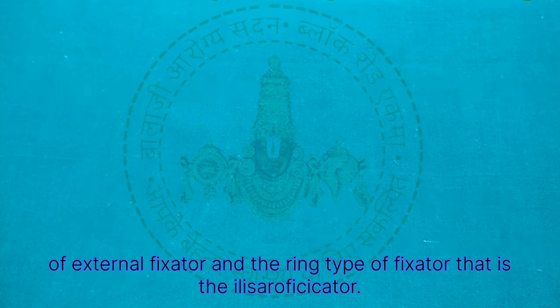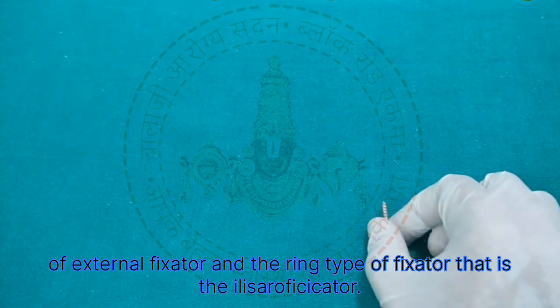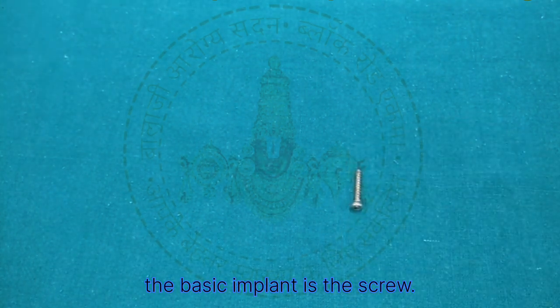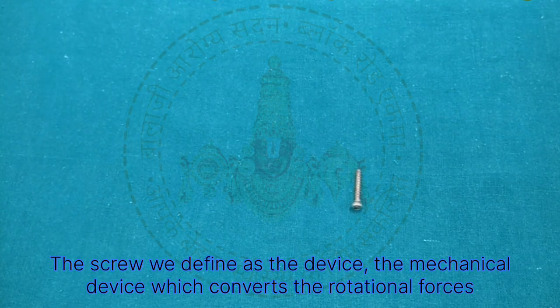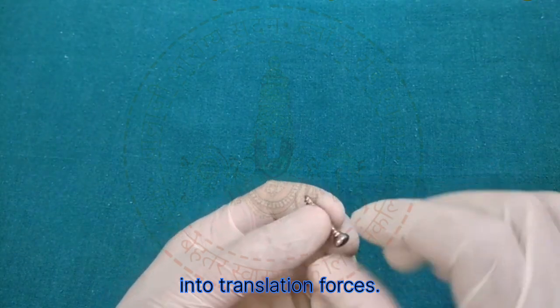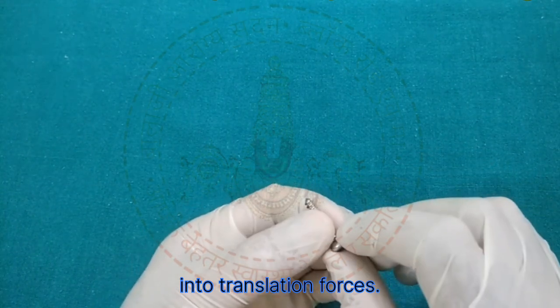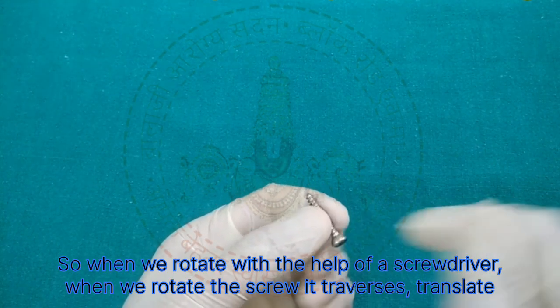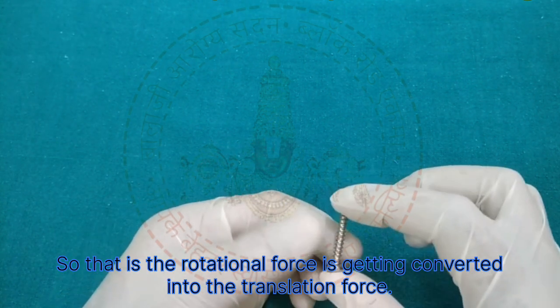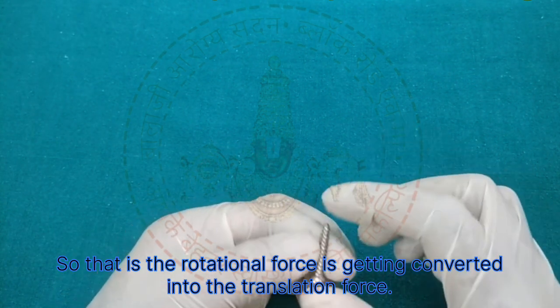So before starting, the basic unit used in the implant, the basic implant, is the screw. The screw we define as the mechanical device which converts rotational forces into translation forces. So when we rotate the screw with the help of a screwdriver, it translates forward. So the rotational force is getting converted into the translation force.